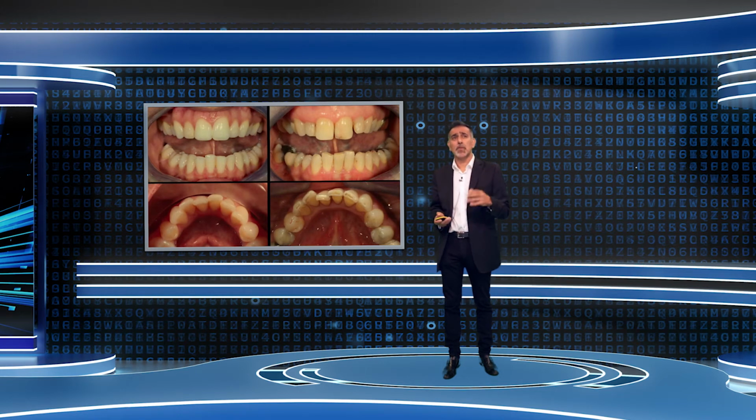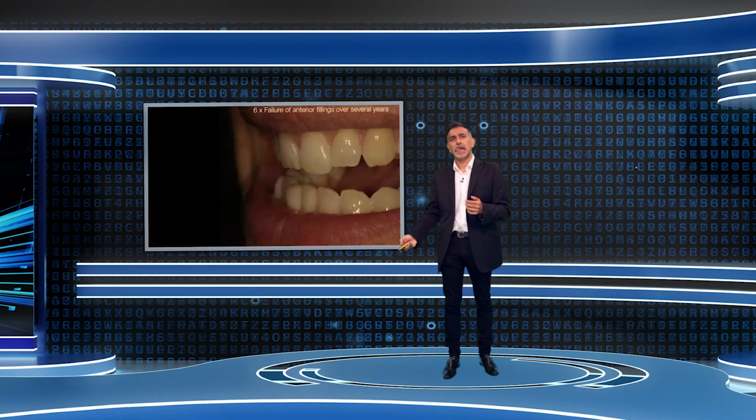Here's another example of a daughter and a mother. Again, it's very interesting to look at the inclinations of the teeth, to look at the crowding, and start to predict where the teeth are going to go. And I would say the daughter is in a crowding position slightly worse than the mother is right now. So over time, we're likely to see deepening of bite, more wear, perhaps more canine collapse as well.